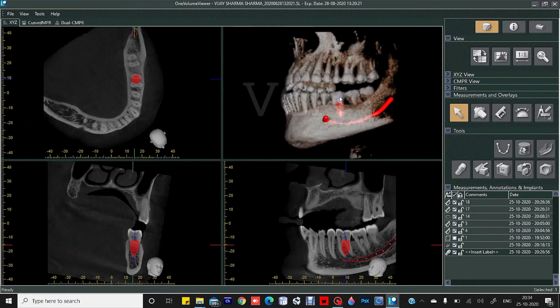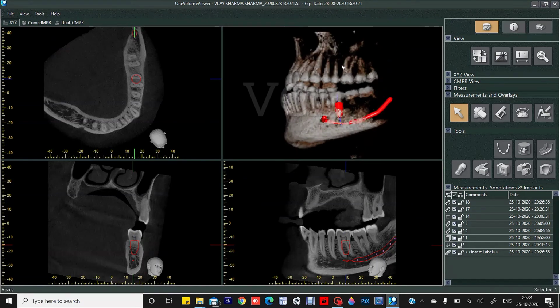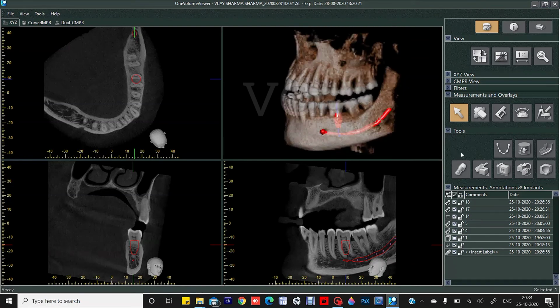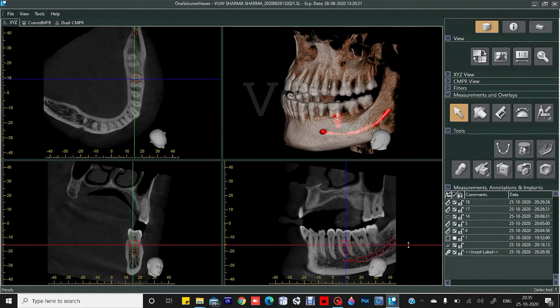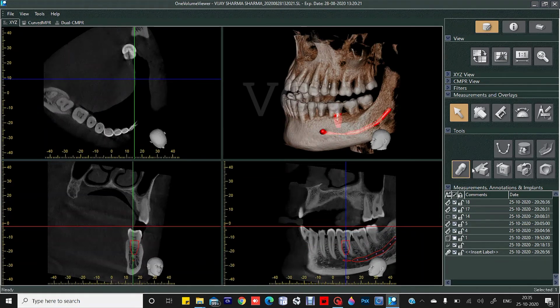Yeah. We are done with virtual implant planning. Now just to view the volume rendering in a proper orientation, we can also give static volume cuts. You just have to press this and cut the volume according to your need. For example, I'll just unhide these lines.